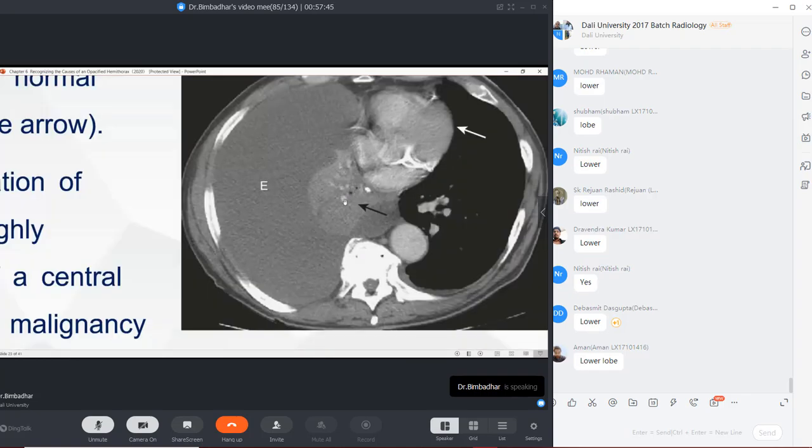And there is no tracheal deviation. There could have been a tracheal deviation, but I'm not looking at that level. And now you see here, the heart also moved down to the other side. I cannot completely see the right pulmonary artery, but here it came down into the central line, which has to be present down here, but now it came to the central line. Now this is actually happening because of a bronchogenic pulmonary carcinoma. So here it is, the mass, right?